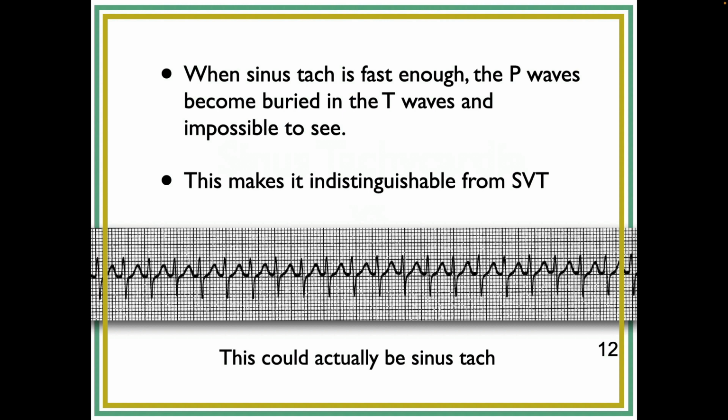So the dirty secret is that this could be sinus tach. The reason we can get away with this umbrella term of SVT, of AVNRT, AVRT, junctional tach, and atrial tach, is we treat them all the same. All of those rhythms will respond, for example, to cardioversion.